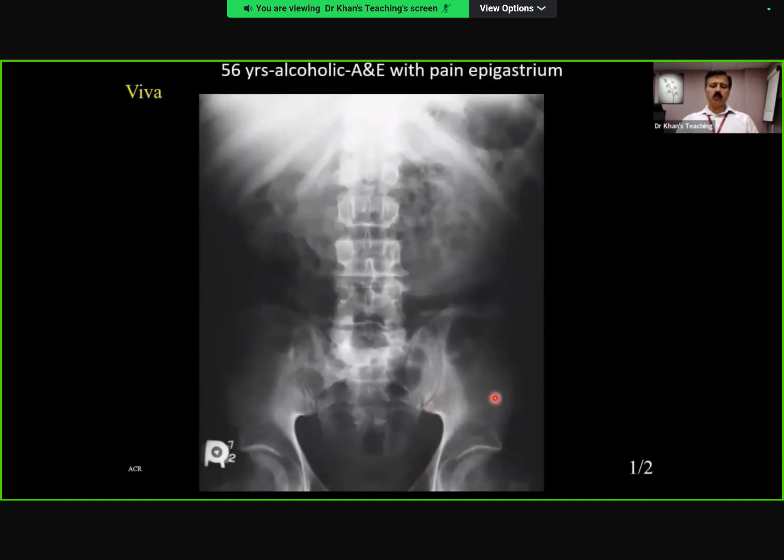Classical 2B film. I've been very kind as an examiner to give you this history. But because of time factor, I have given you this history. But this is a classical, very good 2B film. Over to you.